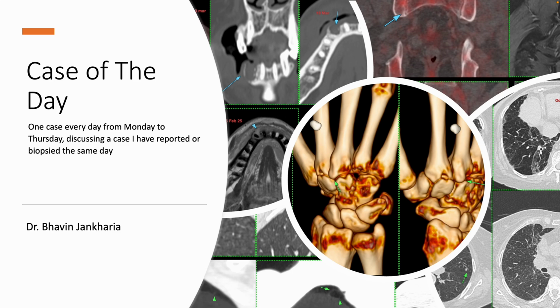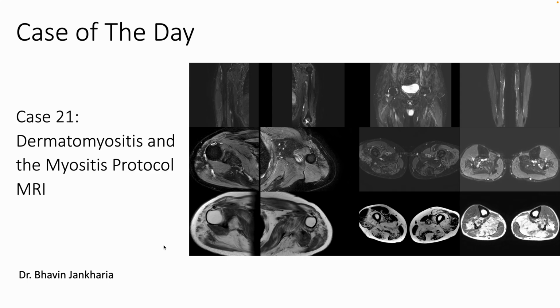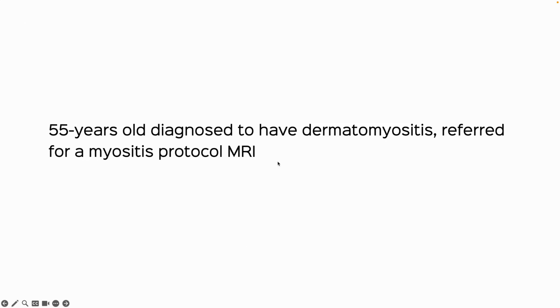And we made it to the sixth week. I didn't think I would last this long. And here we are on our 21st case titled Dermatomyositis and the Myositis Protocol MR. This image actually sums up the entire protocol and case.